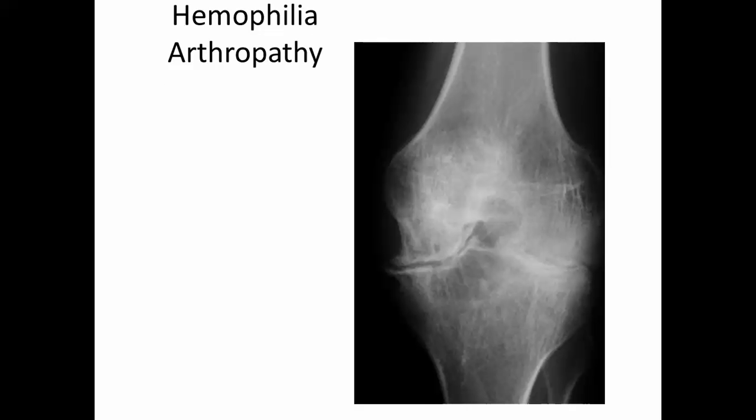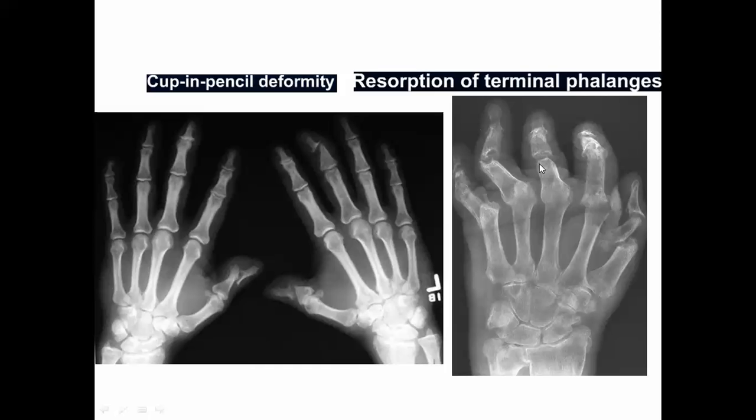Hemophilia is characterized mainly by the osteoporosis around the intercondylar region with wide intercondylar fossa and minimal sclerosis around. The joint appears bigger and osteoporotic with appearance of the coarse trabeculae and disappearance of the fine ones. Hemophilia. And this, as we said, is psoriasis, and in psoriasis you can get again acroosteolysis, or cup and pencil appearance.